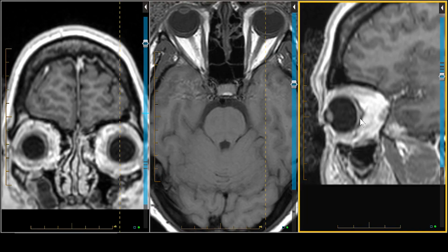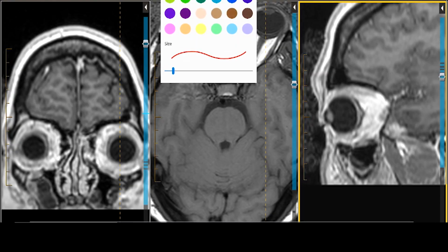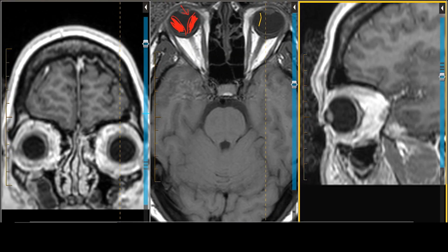retinal layer. Now, the reason that that's important is that in detachments on MRI, the pattern is usually indicative of the type of detachment you have. So if you have a detachment that looks kind of like this, that comes to a V in the back, where the effusions and the hemorrhage is marginated by what we call the ora serrata, and it makes this coalescent V, then it's a retinal detachment. On the other hand, if it goes the other way, if it's convex inward and then sort of makes almost like a column like this but doesn't converge, that's going to be more consistent with a choroidal detachment. Just a little pearl for your perusal and interest.